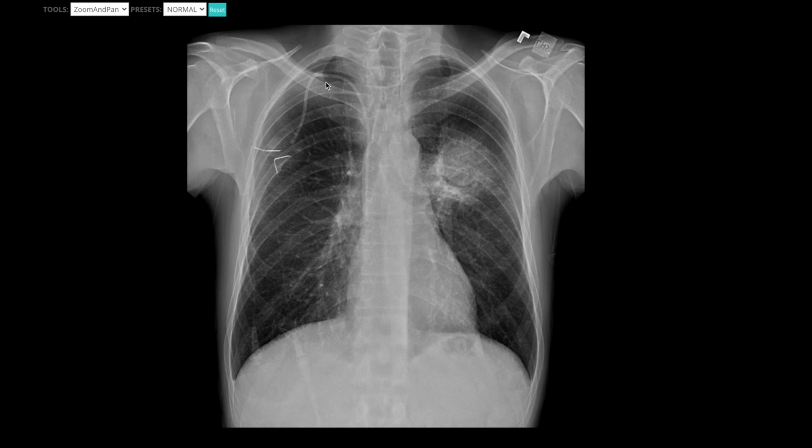What I do is I'll go from posterior to anterior, posterior, anterior, posterior, anterior. I follow every single rib. And if you aren't familiar, these are the posterior ribs, and then these are the anterior. They loop from the back and go forward, loop from the back and go forward.